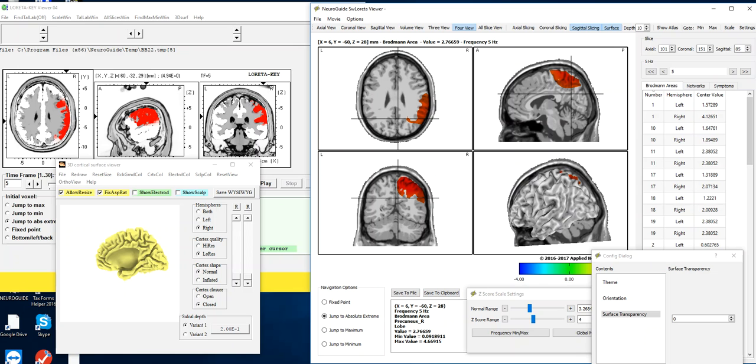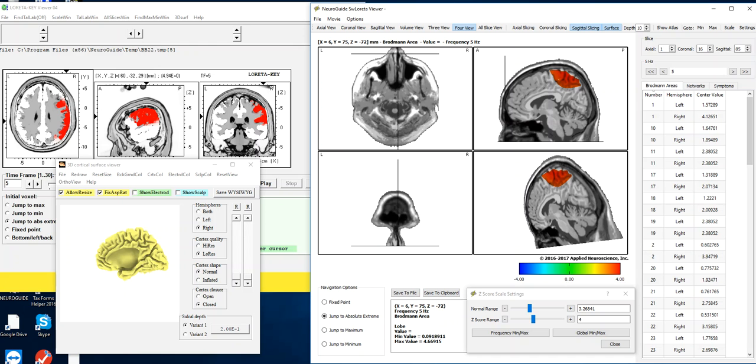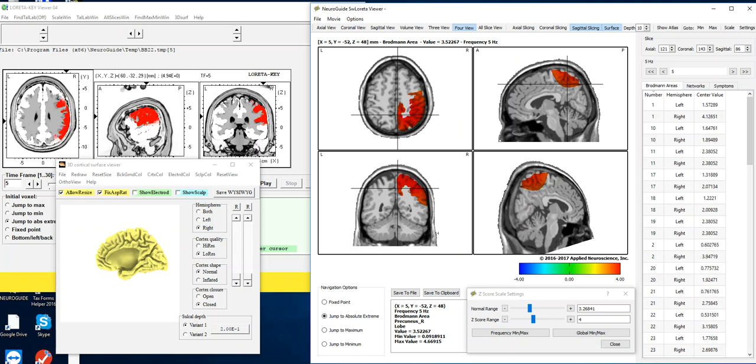And if I want to just get rid of this surface here so I can look in the volume onto the mesial surface, then I'm going to make transparency by clicking Settings, Surface Transparency equal to 100. I click OK. And now we got this same view here as in here, but this is a volume. It's just a slice. It's a single slice. I accidentally hit that. Need to get back into the plane of things. But you can see that that's what it is, just a slice.